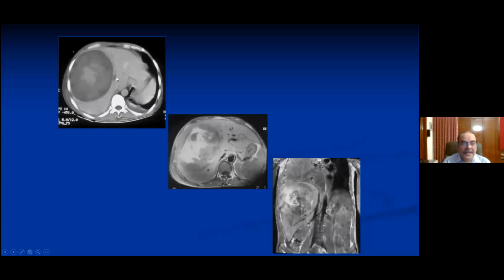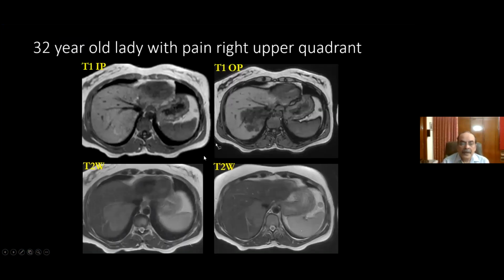So this is a non-contrast CT, where you have this hyperdensity within the center of this very large lesion. T1 weighted MR shows you bright signal on T1. There are very few things which are bright on T1. Hemorrhage and fat are amongst them. Then there is a particular sequence that we do on MR. No need to go into the physics of that, but just remember that there is a sequence called the in-phase and the opposed phase sequence, which can detect the presence of intracellular fat within the lesion.